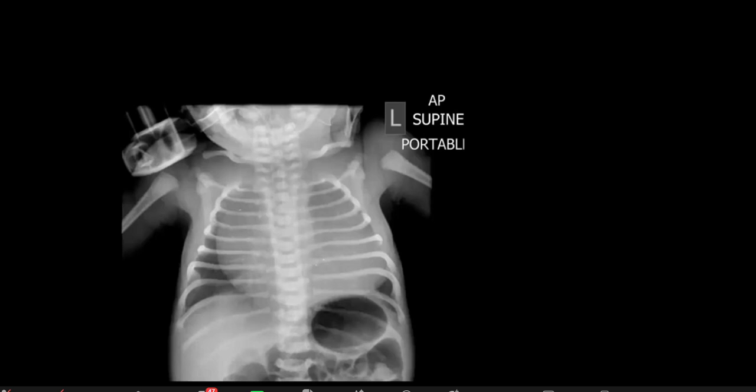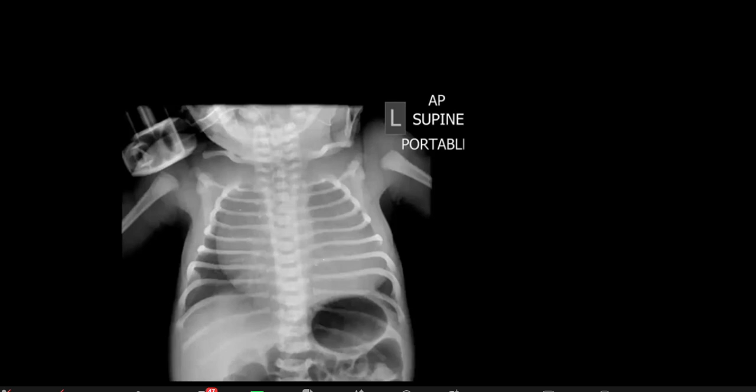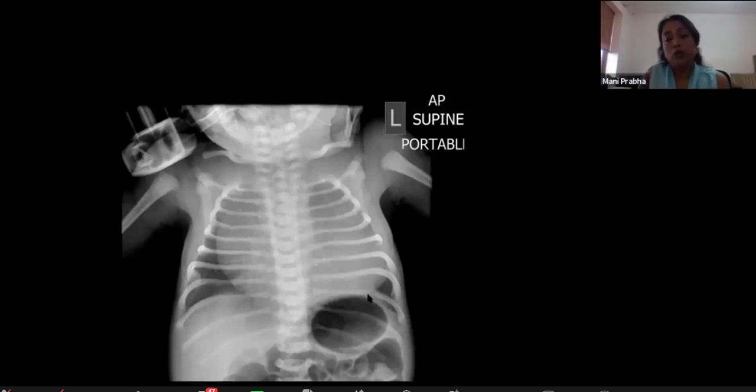So, in summary, I can see an endotracheal tube, which I should have mentioned, appropriately sited. So, in summary, this is massive cardiomegaly with reduced pulmonary vascularity, which would be most in keeping with Ebstein anomaly of the heart. Incredible. Yes, wonderful. So the situs is solitus and the apex is on the left side. The aorta is on the left side, normal side. Pulmonary arteries are not seen.